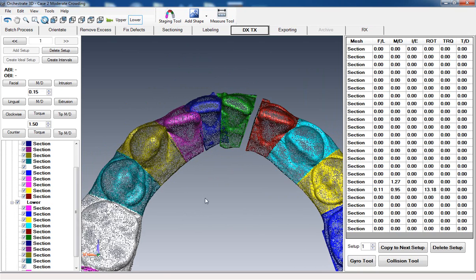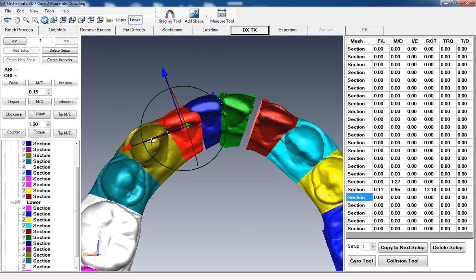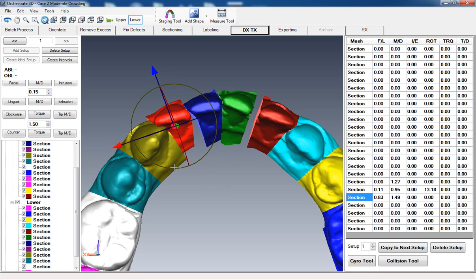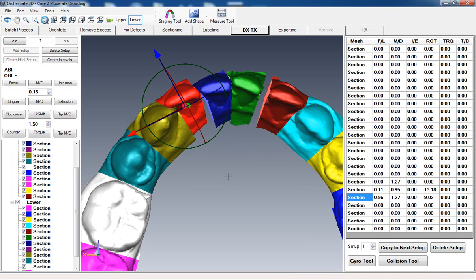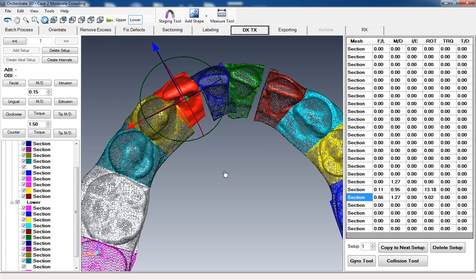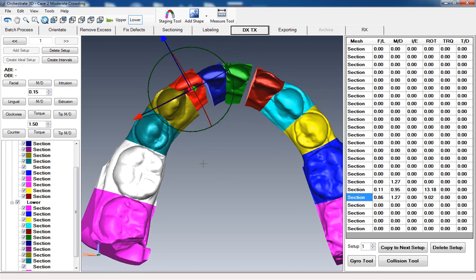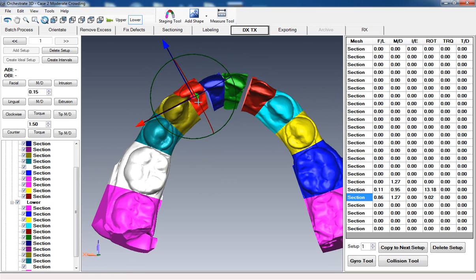Okay, next step is going to be to take the lateral incisor, move it distal, and move it facial until there's just a slight space. And then we're also going to rotate this, move it to where it's the approximate position next to the central there. And now, again, this happens 99% of the time, it seems like. We're going to take this whole segment here and distalize it.